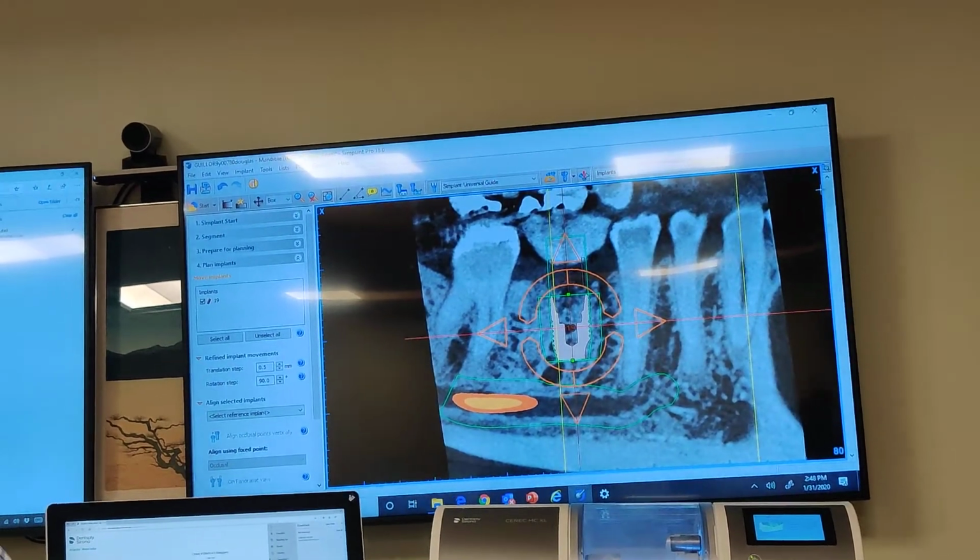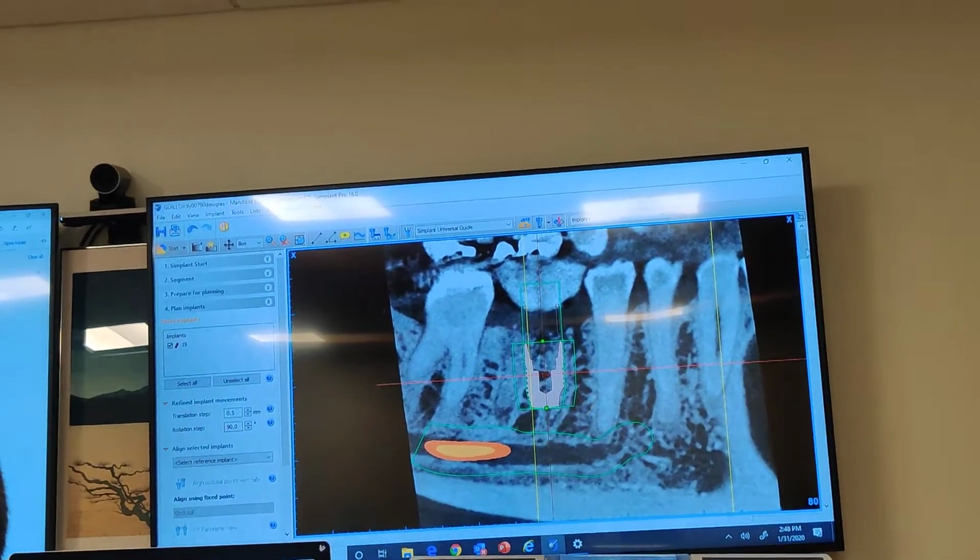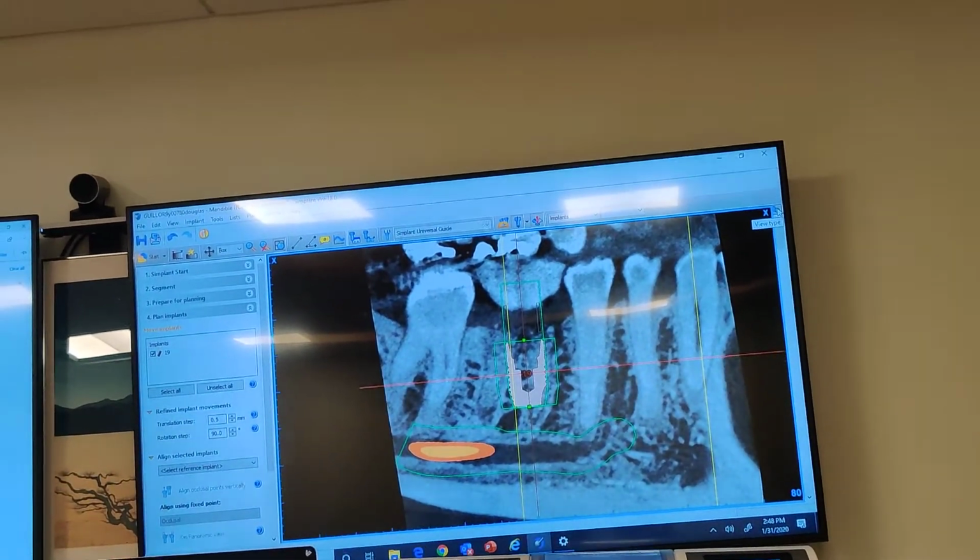So it's nice to take each one individually, like the sinus. Yeah. Right? So that's why I said that. Yeah, that's a great point. It's a great tool. It's very unique. Most systems you can't do it.